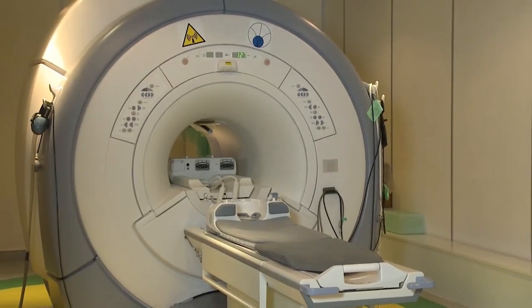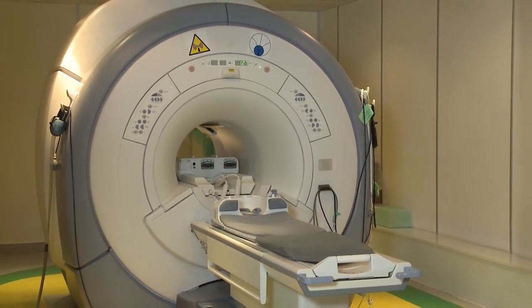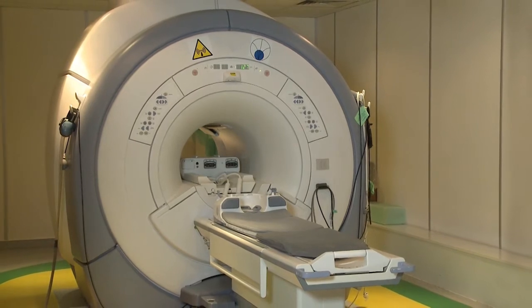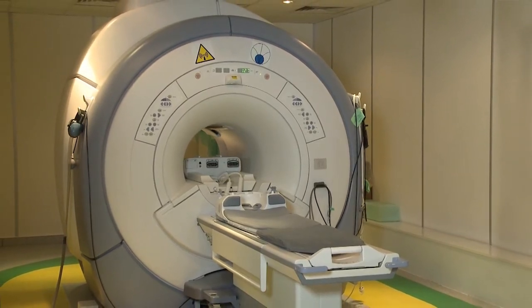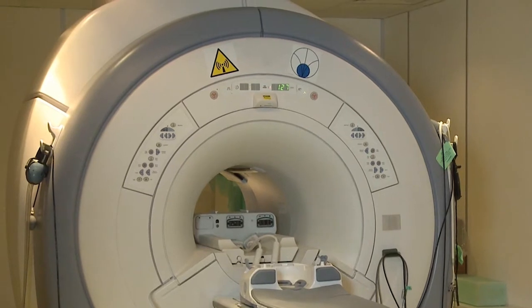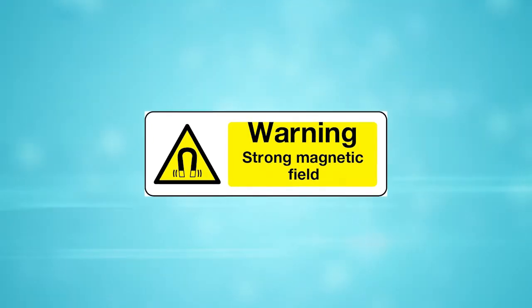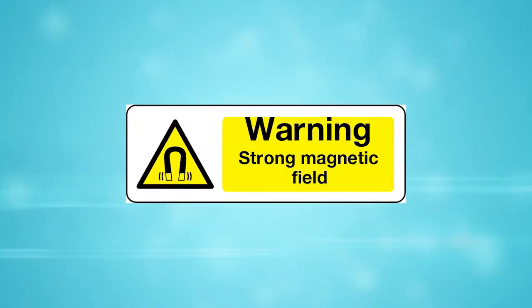Magnetic resonance imaging is an advanced diagnostic technique used in medicine. The examinations are performed using a magnetic resonance scanner. This imaging technique does not apply the potentially hazardous ionizing radiation. A very strong static magnetic field is produced in each magnetic resonance scanner.